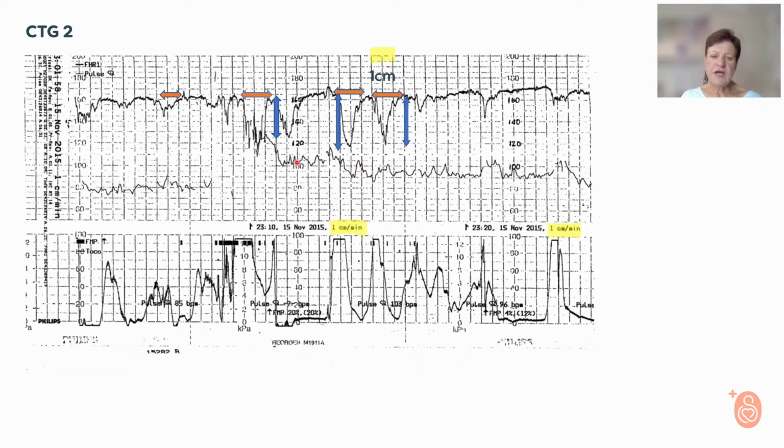So if we look at the relationship between the decelerations and the contractions, we see that there's almost no relationship. There are some decelerations like in here where there are almost no contractions, and also we're not 100% sure that these contractions are being recorded accurately, because it looks a little bit, I almost want to say chaotic, with the contractions.